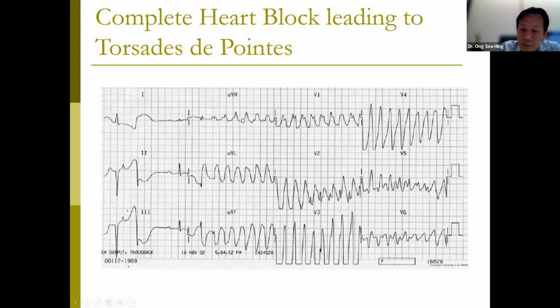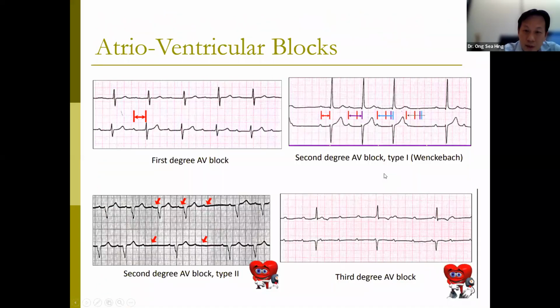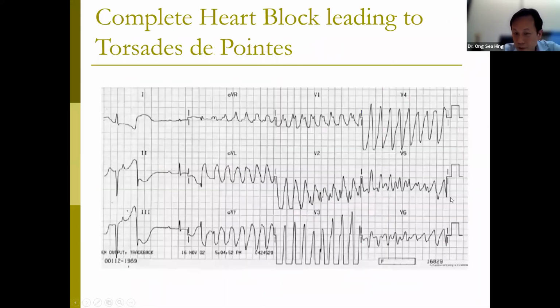Now, that particular patient, if you remember this patient, the 84-year-old lady, very slow, we planned to bring her to ICU, and then we were getting the team back, the radiology lab, to put in a temporary pacing wire. But while we wait for the radiology and the patient is on the telemetry, this is what happened. Bradycardia can sometimes lead to ventricular tachycardia. If you look at this ventricular tachycardia, you see a sinusoidal pattern.